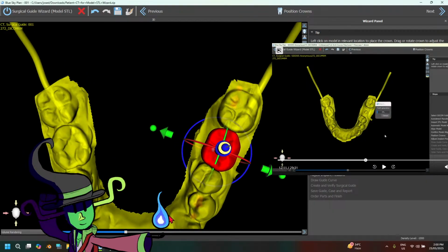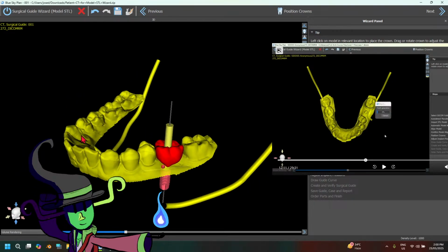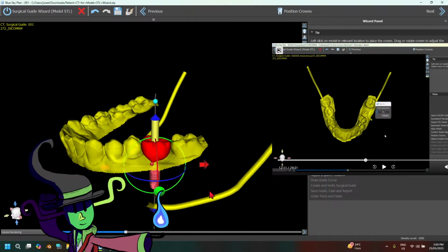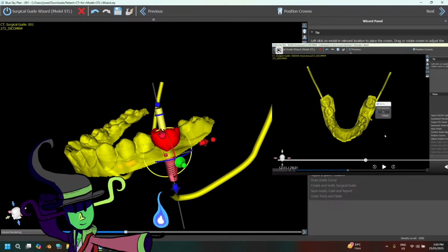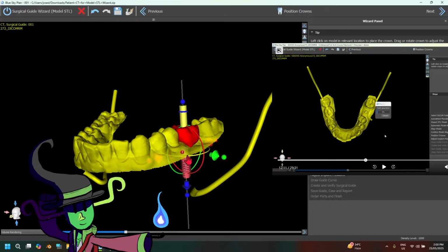Anyway, what we got here? Look at that, our implant, I guess. And you can also, oh, look at that. If you guys use Blender, I guess this sort of looks familiar to you. This sort of reminds you of the gizmos that Blender also shows you if you want to move things around, scale it, rotate it, and stuff.